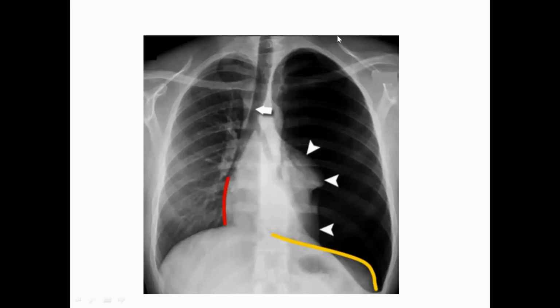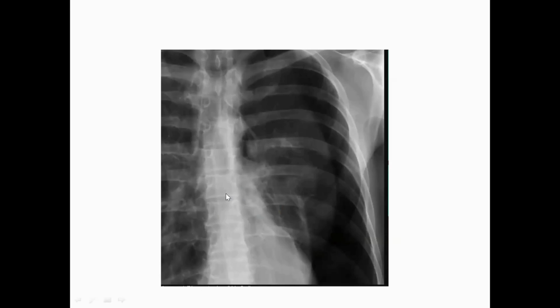And this was the shifting of the trachea and heart. Okay? Here, if you see here, this is another feature of pneumothorax. So here, this pneumothorax extends from the apical toward the lower zone. Okay, so here there is a rule.